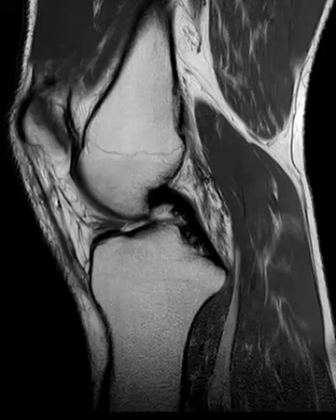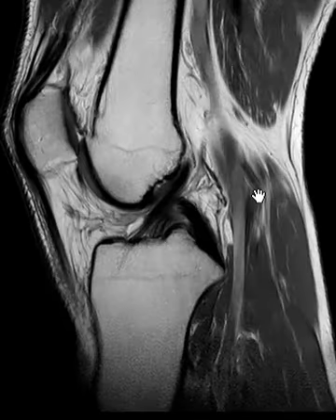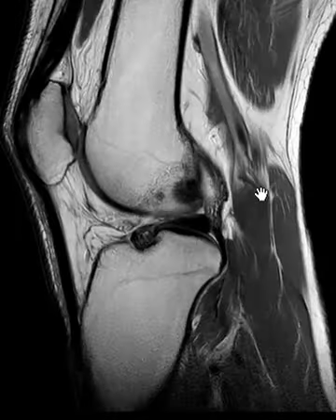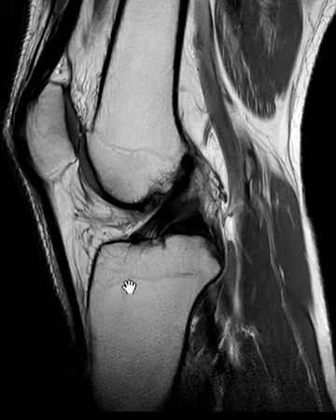This is a 47-year-old male with complaints of knee pain, no trauma, and he has abnormal signal in his medial meniscus. So to get oriented, this is a sagittal view where the kneecap is off on the left. This big bone here is the femur. Above the knee joint, this is below the knee, the tibia. We see the ACL coming down obliquely.